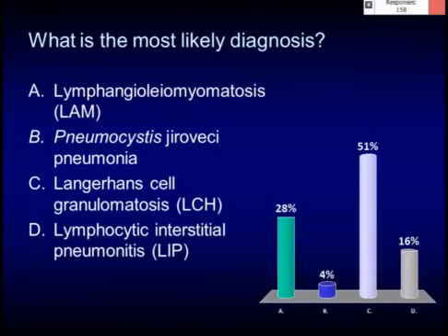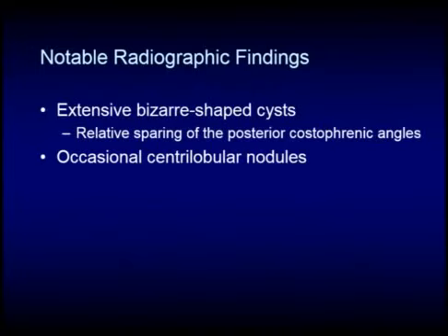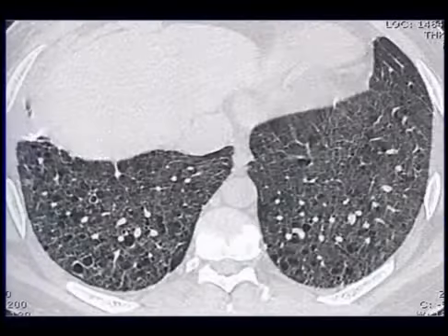I think the key here, this is a cystic lung disease. They're clear, defined cysts. They're walls that are appreciable. Moreover, the intervening lung that separates these cysts was not normal. The unaffected lung actually had slight nodularity and irregularity, and that's really one thing that, as Rob will talk about, will help distinguish a disease like Langerhans cell histiocytosis, where the intervening lung is often nodular because the disease often starts off with nodules that cavitate and then form cysts, versus LAM, where the intervening lung is almost pristine.